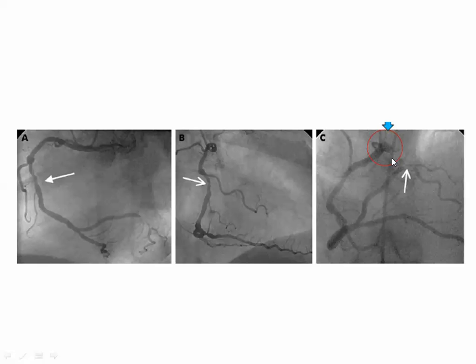So as Ismail said, this what? This AP. So what's the walls? Anterior, apex, inferior. And this is the oblique, not perpendicular but oblique to some extent, AV, because here my rest is AV atrioventricular surface, okay?